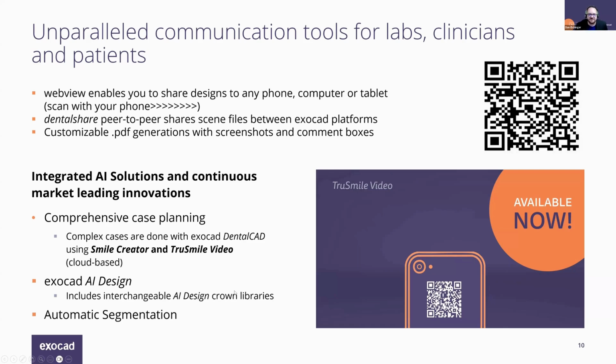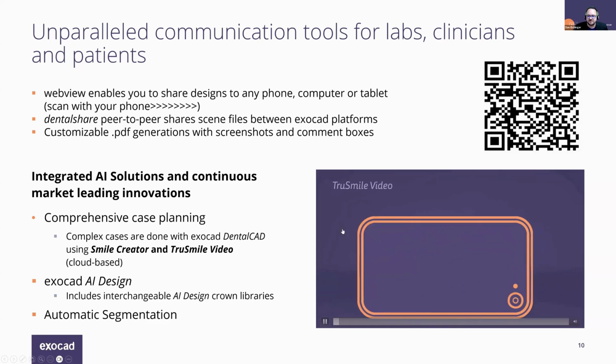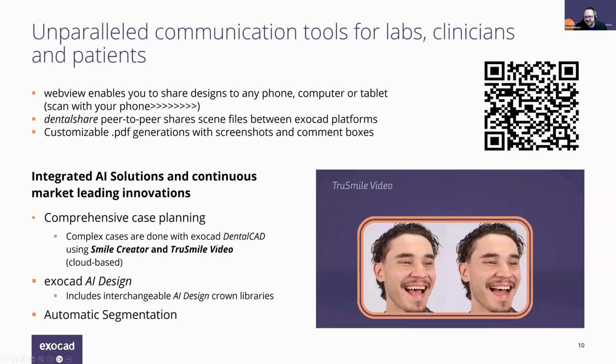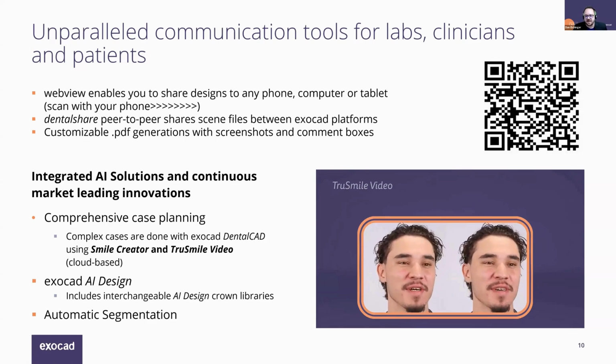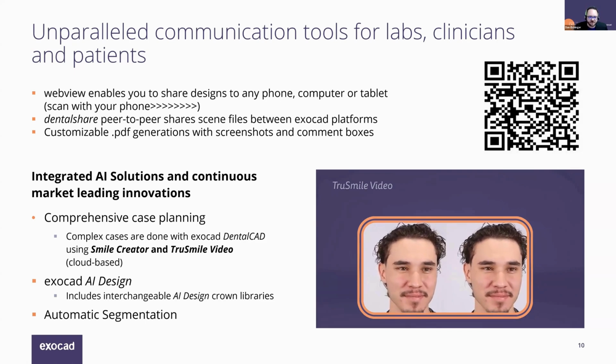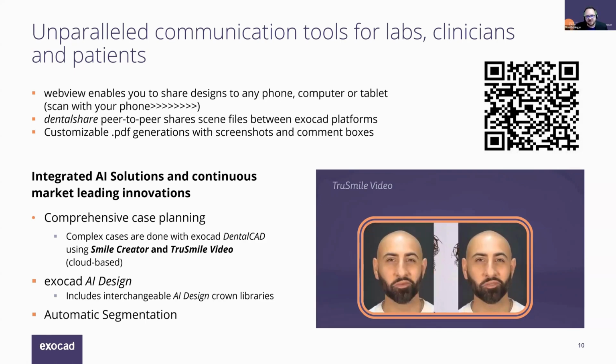But probably one of the cooler advancements in treatment planning that we offered, or I've seen in some time, is this video here on the right. So True Smile Video allows you to upload a video of the patient talking, smiling, laughing, a maximum of 30-second video. And at the end of your design, you upload that to our cloud service, and that service is going to replace the patient's teeth with your design.